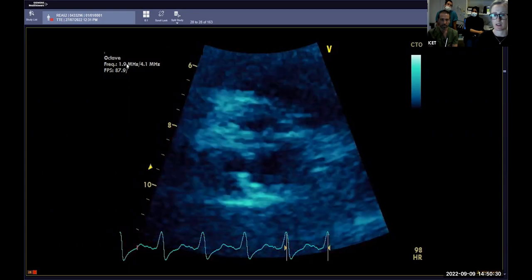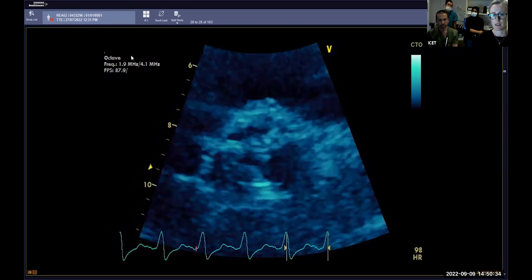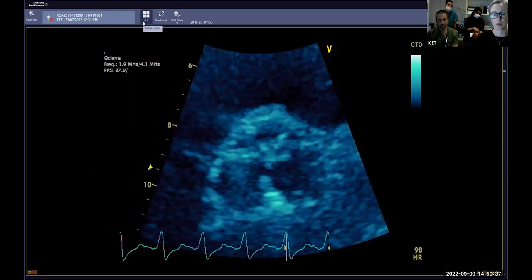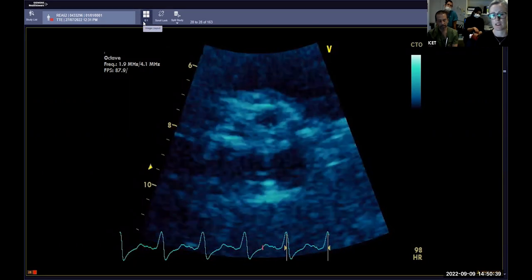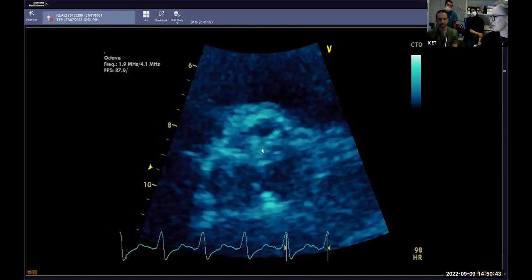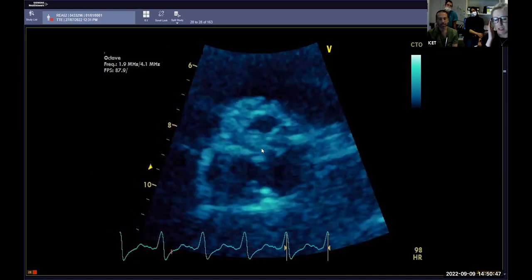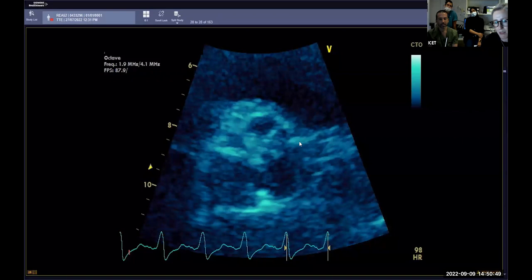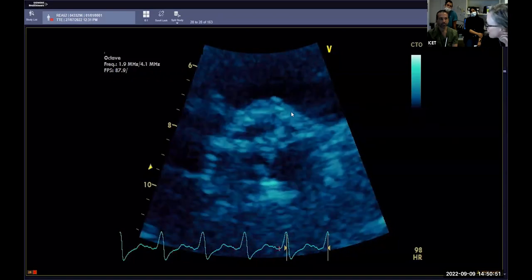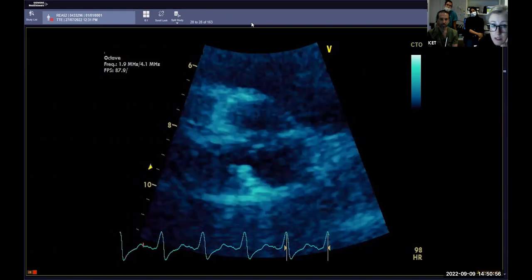I can see this going more smoothly with imaging. I think someone could try and slow it down and do a planimetry, but I think that'd be tiger country in this case because you can't see any edge anywhere, so I think it'd be completely useless. It'd be very tricky because you get all the blooming artifact. It might be slightly better with transesophageal, but even then it could be quite tricky. You could still do it, but I just wouldn't trust the numbers.